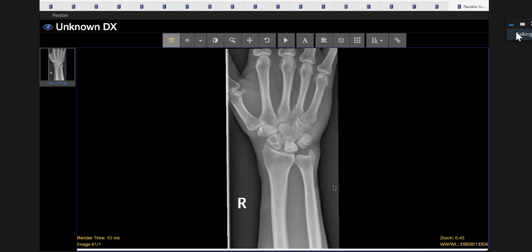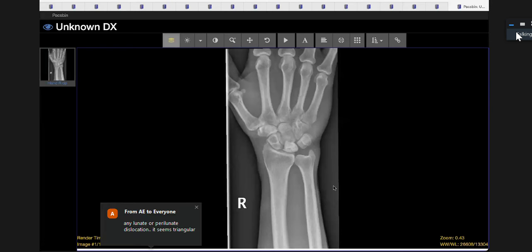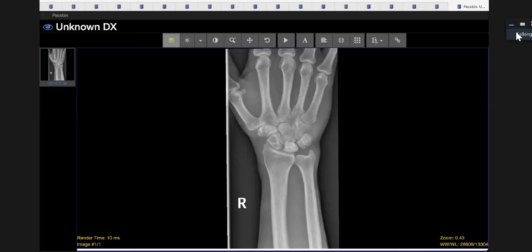I always think it should be the other way around, because there may be impaction between the ulna and the lunate, but I don't know why it is negative. I don't think anyone knows the association, but there is one. Otherwise, it's an idiopathic disease, and it can cause fragmentation, which is what you're seeing there. That lucent line you saw isn't artifactual; it's fragmentation, because the bone is just crumbling away now.